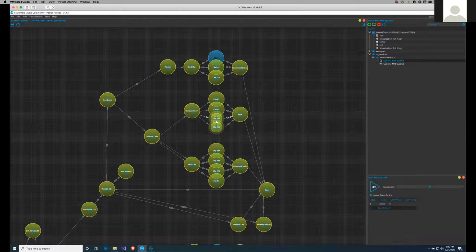But that particular setup really enables you to create fully unsupervised neurofeedback applications that still represent your style of doing sessions, your particular psychological style, NLP style, whatever it may be. It's a fully generic approach to enable you with household tools. The household tools here is just that you need to be able to record an MP3 file and upload it and create a fully interactive audio visual neurofeedback or biofeedback session that also has a psychological component to it.